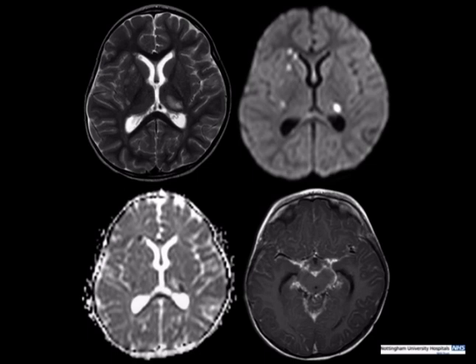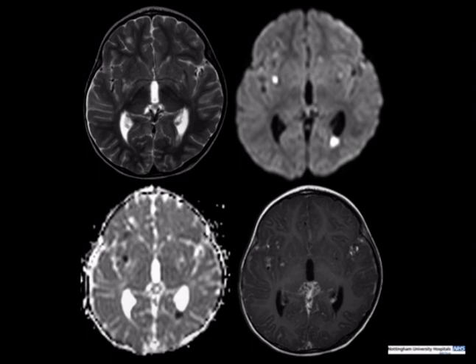On the post-contrast imaging, you can see this avid caking enhancement around the basal cisterns. Now, when you do a paediatric MRI of the brain under GA, you often see quite avid enhancement of the vessels over the brain, even in normal children, and it can be quite difficult to decide for definite whether there's abnormal leptomeningeal enhancement there.